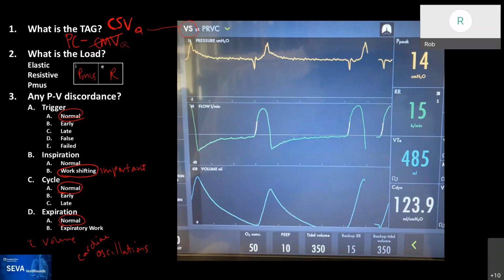And again, we have a set tidal volume. So again, it indicates that this is adaptive targeting. So if this looks like volume or auto mode, PRVC VS, and if that's true, then you have spontaneous breaths mixed in with mandatory breaths, and it's type 2 IMV, meaning that, as you can see here, there's no mandatory breaths because the spontaneous breaths have suppressed them because the spontaneous rate is faster than the set respiratory rate.